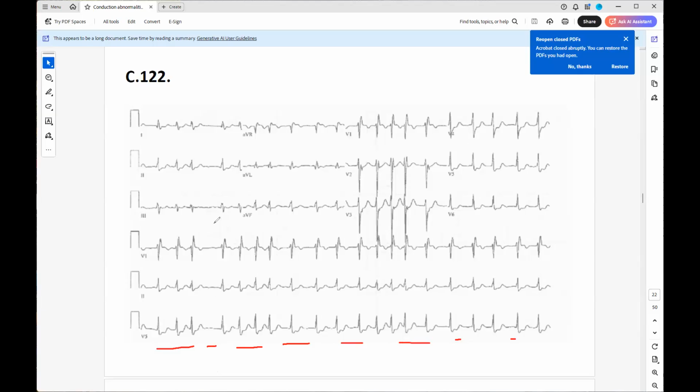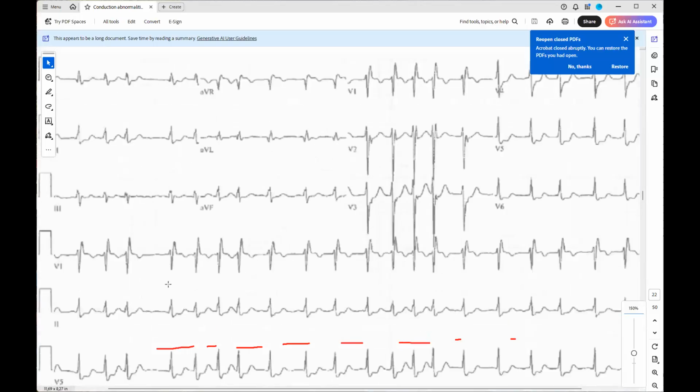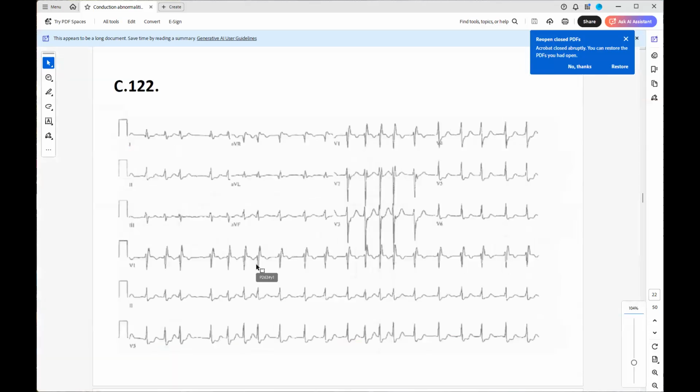Do we have a P wave? Yeah, at the second lead number 2, I think. No, this is what I said, this is the T wave. If you do have a QRS complex, you have to have a T wave. So there is no P wave. What does it mean? Arrhythmia, no P wave.